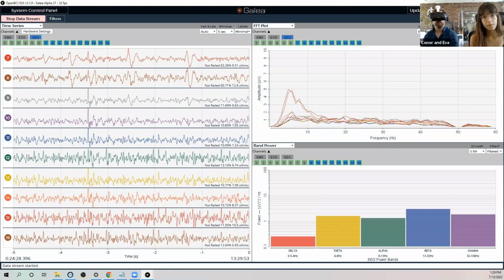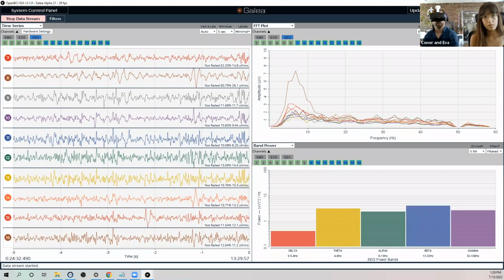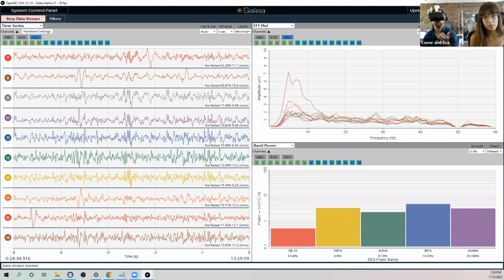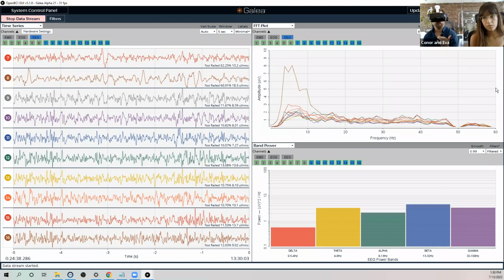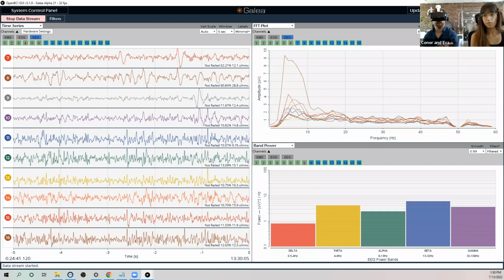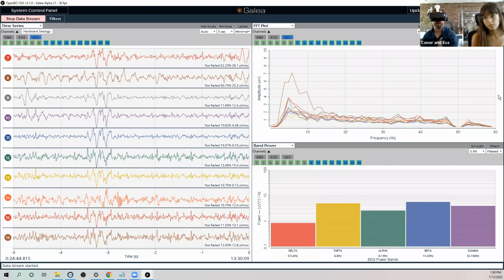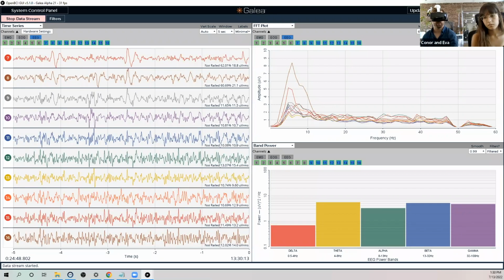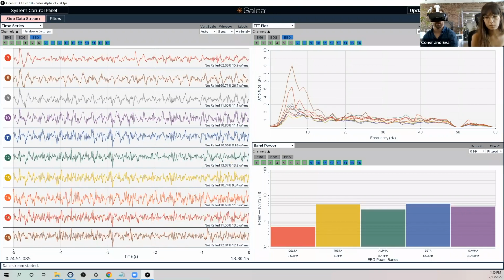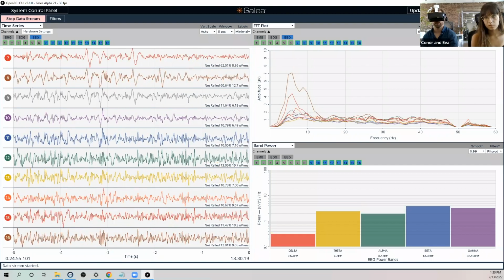We're really trying to optimize for the setup time and make the setup as easy as possible. For those of you who were here from the start of the call, you could see that I started with the headset off my head and I put it on. Obviously I've worked with this headset for a while, so I know a bit more than your novice in terms of how to adjust it. But it took us less than a minute to get the headset connected with all 16 channels of EXG and the auxiliary data. That's really the goal, to expedite the setup time.